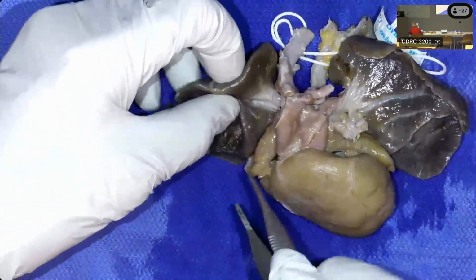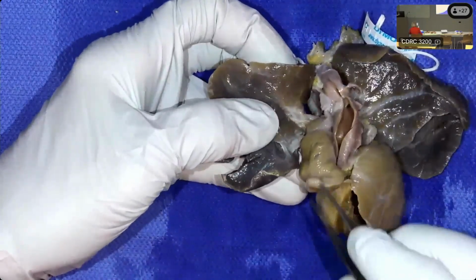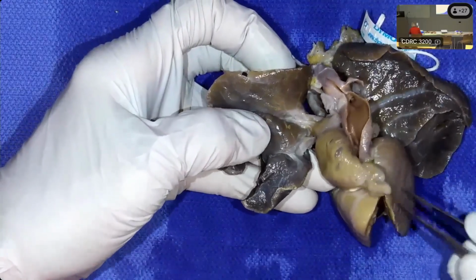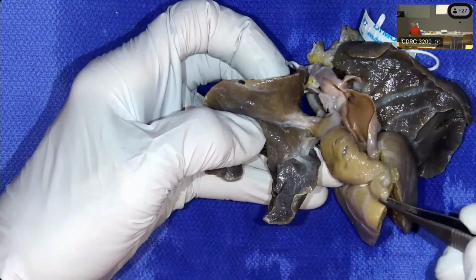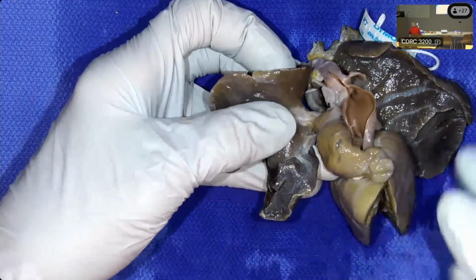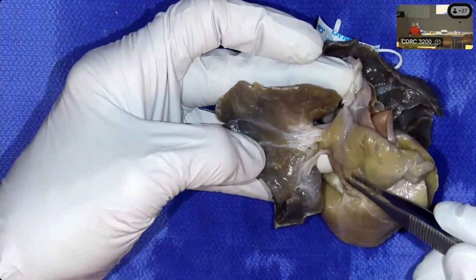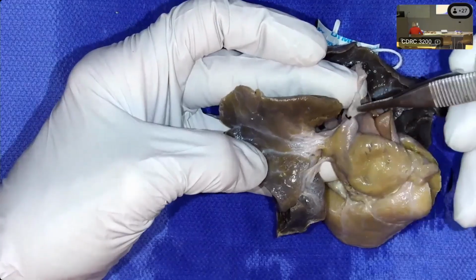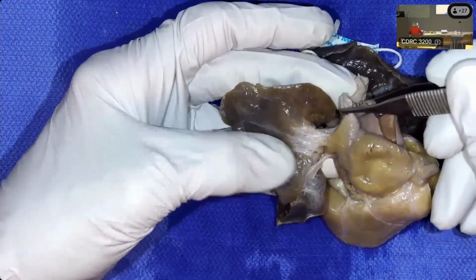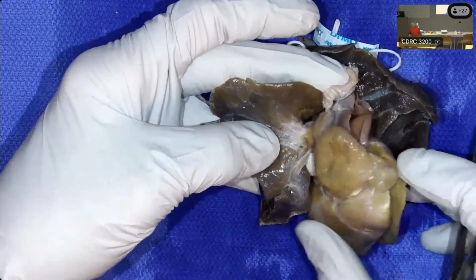And when we look at the atrial appendages in this case, the tips of the appendage kind of have a little bit of a finger-like appearance, but looking at the attachment to the venous component, we see kind of a broad attachment. There was a superior caval vein on the right, but no inferior caval vein.